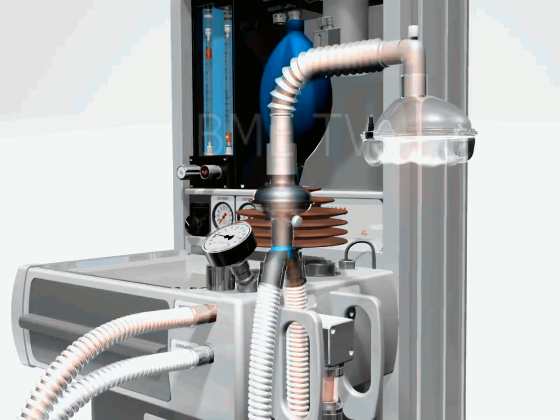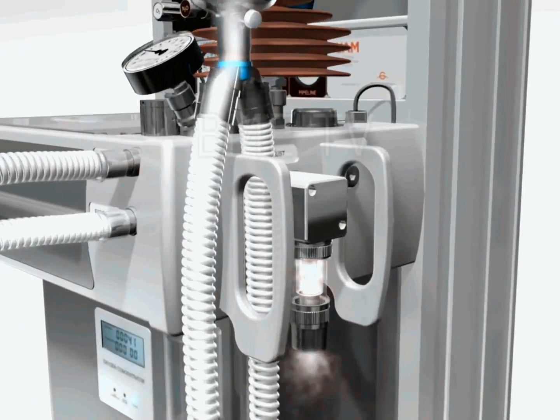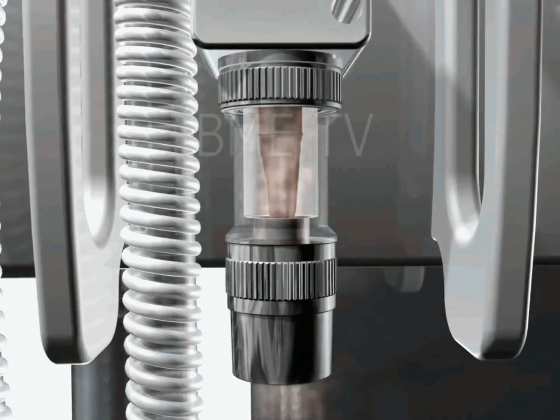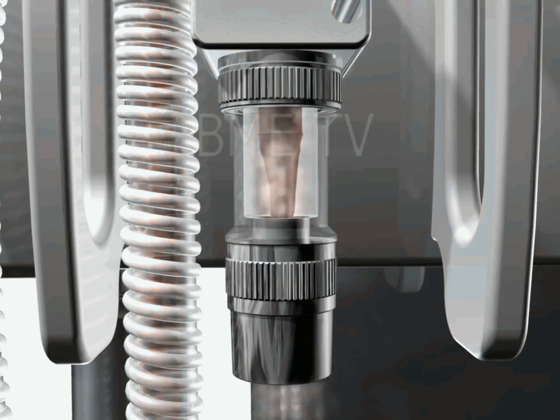Scavenging is the collection and removal of vented anesthetic gases from the OR. Since the amount of anesthetic gas supplied usually far exceeds the amount necessary for the patient, OR pollution is decreased by scavenging. If a fresh gas flow-sized volume enters the breathing circuit each minute, the same flow must leave it or barotrauma will result. Scavenger and operating room ventilation efficiency are the two most important factors in reduction of waste anesthetic gases, WAGs.